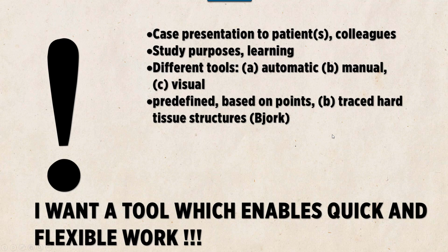There will be no discussion about the purpose of superimposition. Tools which are available in AudaxCeph for easy and automatic superimposition on one side, and also tools for advanced superimposition methods on the other side will be shown. Predefined superimpositions, such as for example the ones proposed by Ricketts, will be shown. We will cover methods for structural superimposition, and we will also show visual superimposition.